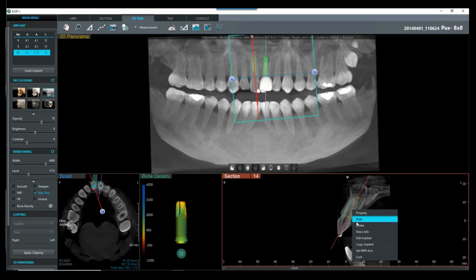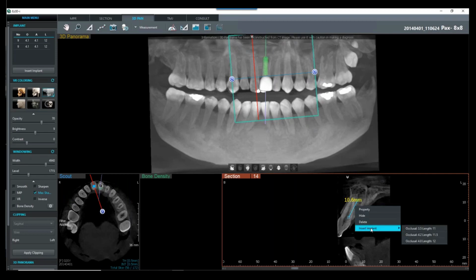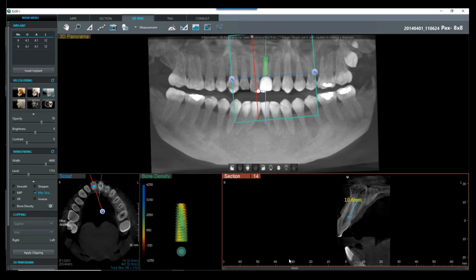So think about using that measurement tool where you just go to measure, you click here, and then you right click, and it will put your implant right along that long axis. It does pick from a generic set of implants there, but you can set it to one company if you would like to do that. So that's one of the other things that I wanted to add there. But yeah, want to go on to the other right click features?